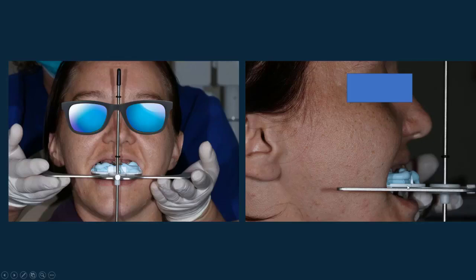So now, when I take this plate off and mount these casts, then not only am I in the right position relative to the joint, approximately, but I also know when I'm looking at that cast on the articulator, here is the facial midline. All right, I don't have to necessarily have the patient in front of me. I know that the occlusal plane, once this is mounted up, should be parallel to the floor. It makes it very easy to now know where to set teeth, okay?